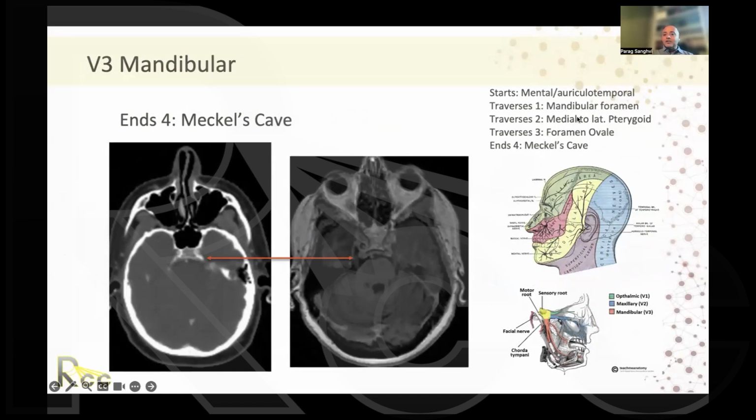So I will say, as I think about these patients, I'm not contouring slice by slice. The first thing I do is I contour all the things, the foramina.